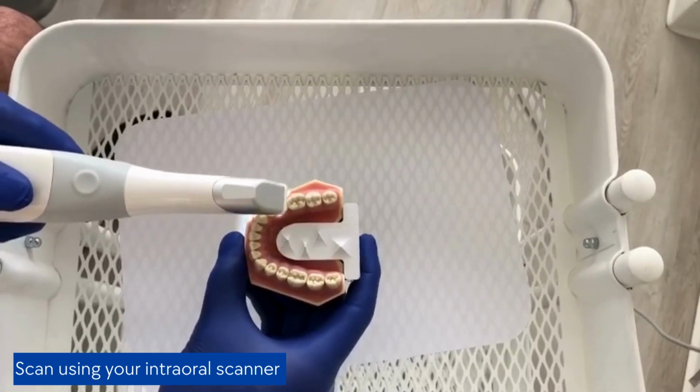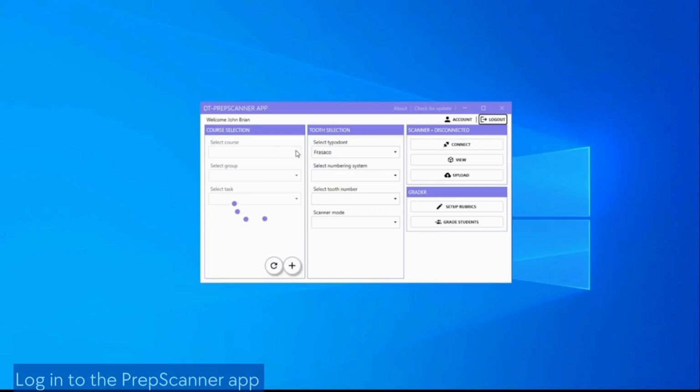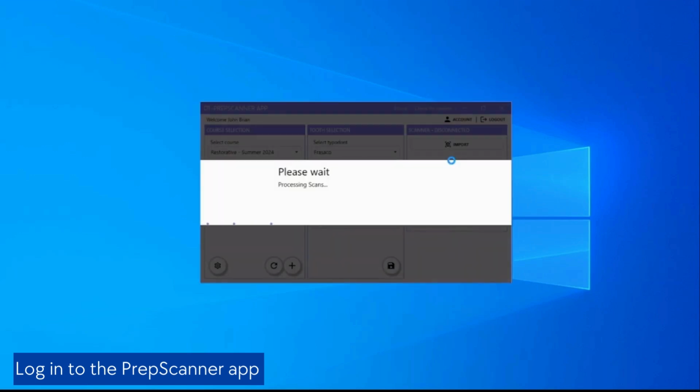In this video, we demonstrate the grading of a Class 2 cavity prep. After completing the scanning process, log into our PrepScanner app using your own credentials. Here's the instructor dashboard activated upon login. To review the model executed by the instructor, click the View button. The system is now processing the files. We are focusing on a Class 2 amalgam prep.